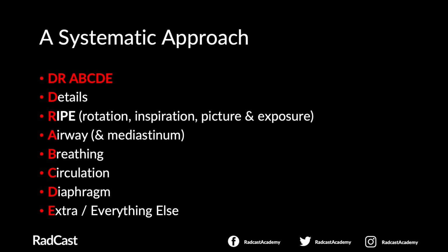We will take you through this system in the following slides and go through the various points to assess in each part of the system, and at each point we will reference a normal slide and then show you an abnormal example. Again, to emphasize, this is one system that can be used to assess a chest X-ray. If you are using a system that can equally assess the chest X-ray to this level and you find it works for you, then we encourage the use of that system as well.